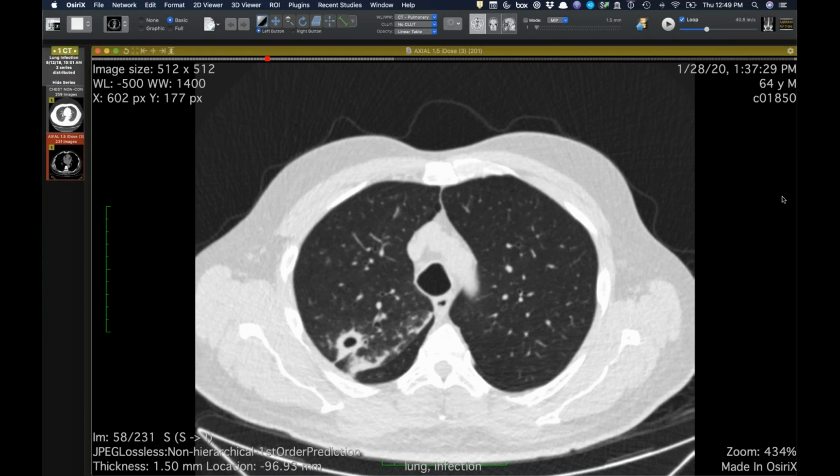Well, I wonder, David, I've seen this distribution that Travis showed more often in male patients, particularly those who have a tobacco history, whereas I've seen some very mild smokers that progress to a fibrocavitary pattern. Right, and it's been described as the classical pattern because it looks like TB.